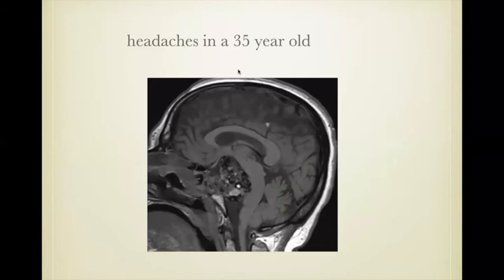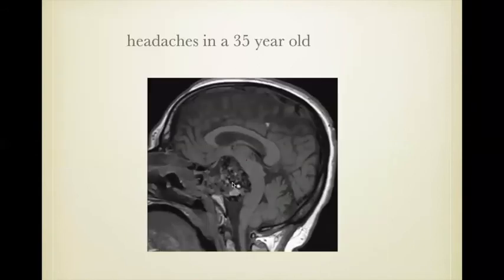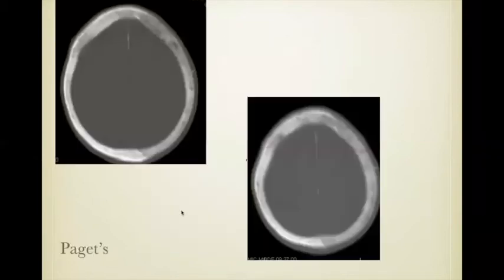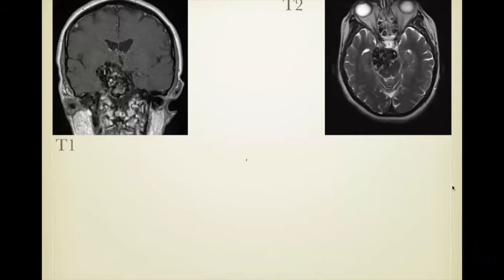Here's a patient who was sent in with this central skull-base mass. You can see this expansile lesion coming from the clivus, has this unusual appearance of areas of high signal intensity with T1 shortening. And you can see that there's displacement of the pons here as the tumor has extended up. There's preservation of the pituitary here, so we're pretty sure this is not of pituitary origin. Here it is on the T2 weighted scan, homogeneously dark.